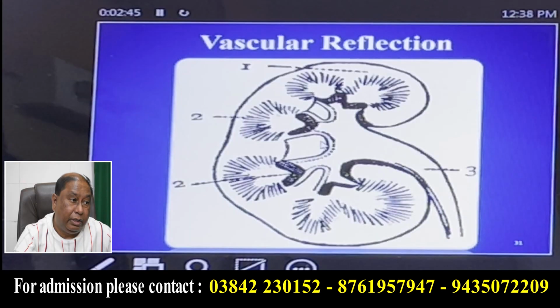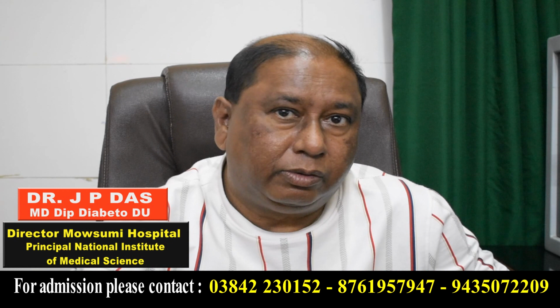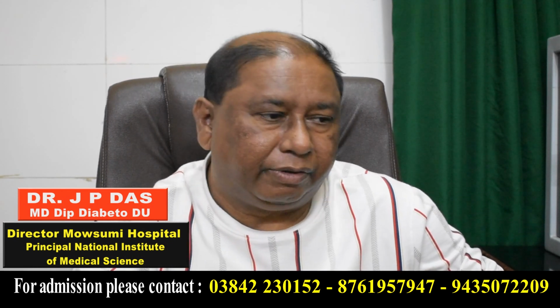They appear in a recognizable pattern. Patterns are very definite. So this allows the identification of stone versus vascular reflection.